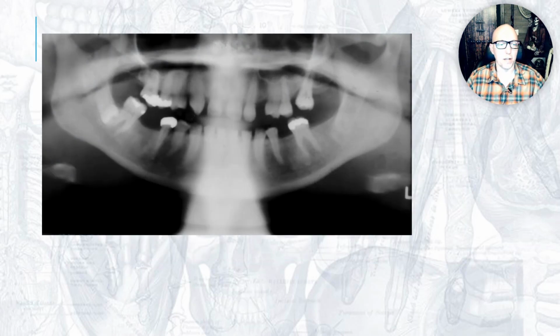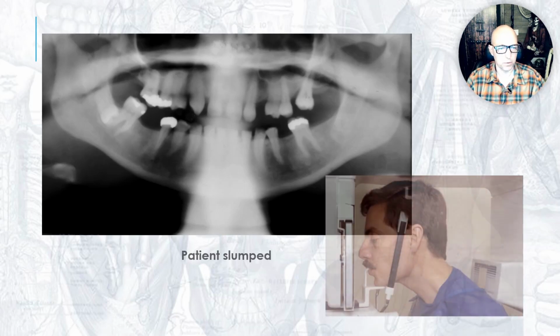All right, so another example here, you have a really pronounced ghost image of the spine. You don't see the TMJs as well, so that kind of stands out as you're used to now looking all around a pano and seeing what's there. You don't see the inferior borders of the orbits. You can also look at the chin. The chin is up too high. It's positioned too high, and I've seen that in some of our images. So make sure that chin rest is where it should be. So a couple problems with this one.